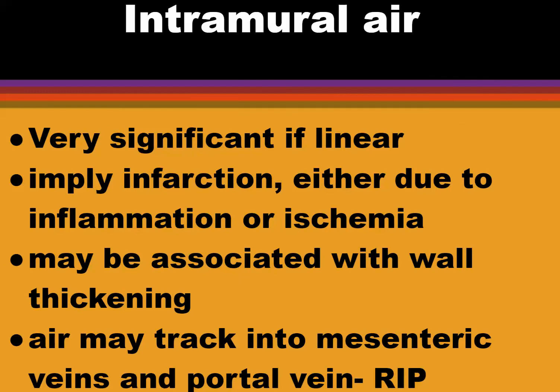Intramural air is really significant because it means that there's air within the bowel wall. There shouldn't be air within the bowel wall, it should be within the bowel. It's bad if it's outside the bowel, but it's really bad if it's within the bowel wall, because air in the bowel wall implies infarction.